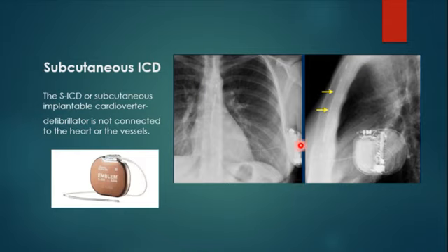This is a modified type of subcutaneous defibrillator. They put the shocking device, or the defibrillator, subcutaneously, and they put the wires around it subcutaneously, not reaching the heart. It is not connected directly to the heart, but will provide a shock for the heart when it senses some sort of arrhythmia. This is a modified subcutaneous.